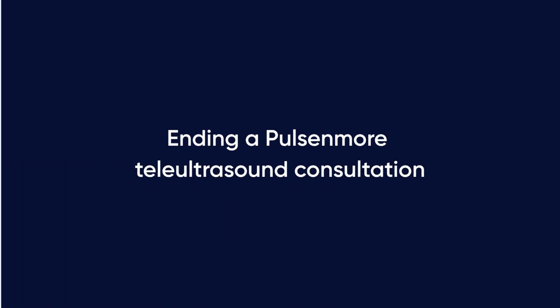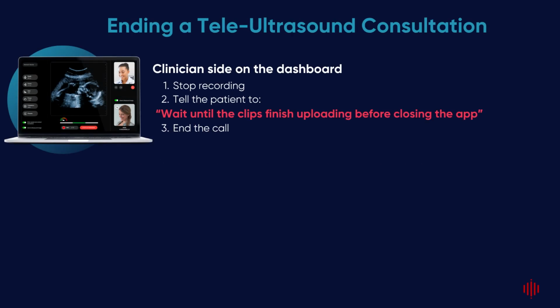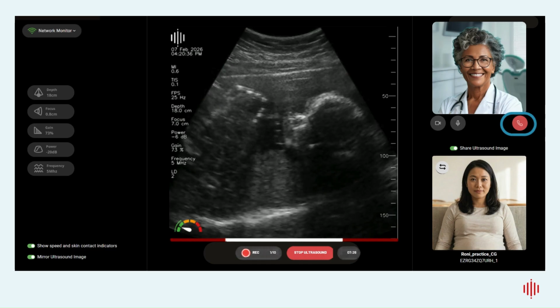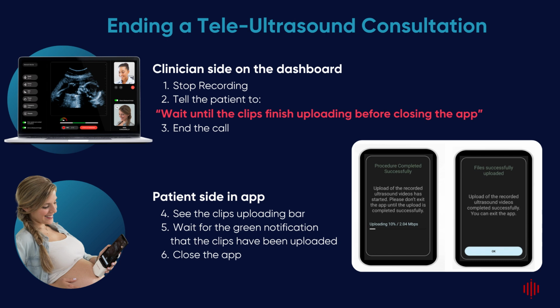Once you have finished recording the scan clip, select Stop Recording. Before ending the call, remind the patient to keep the app open until all clips have finished uploading. You may then select the End Call button and confirm the End Call pop-up when prompted. The patient will be able to monitor the upload progress within the app. Once the upload is complete, a green notification will appear confirming that all clips have been successfully uploaded. At that point, the patient may close the app.